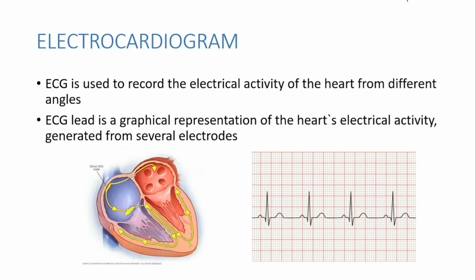And okay, ECG lead, which is very important. An ECG lead is a graphical representation of the heart's electrical activity generated from several electrodes. This graphical representation is called, these are the ECG leads.